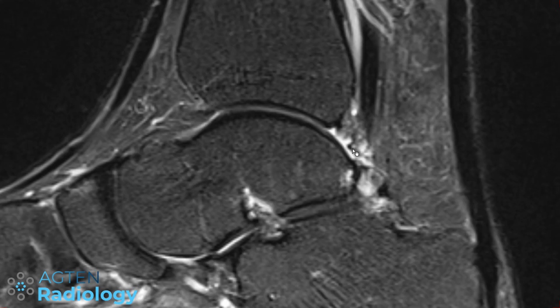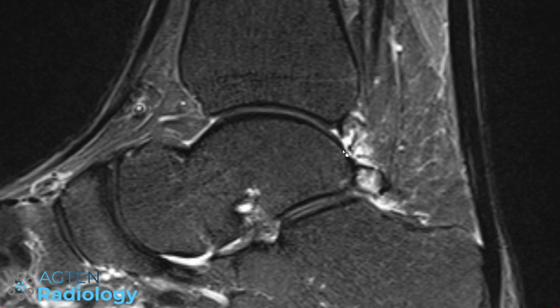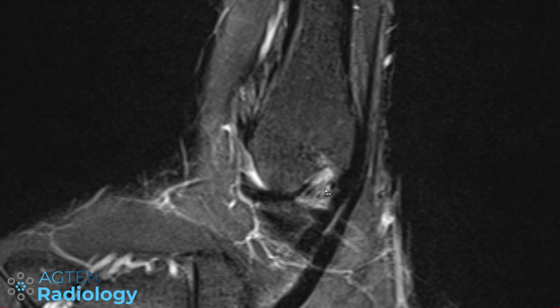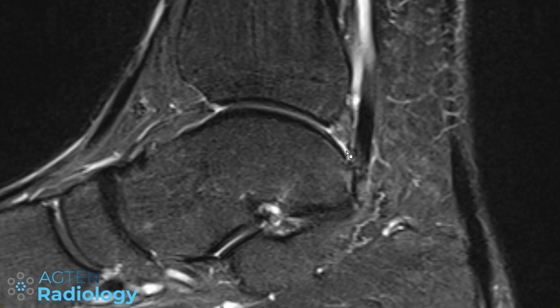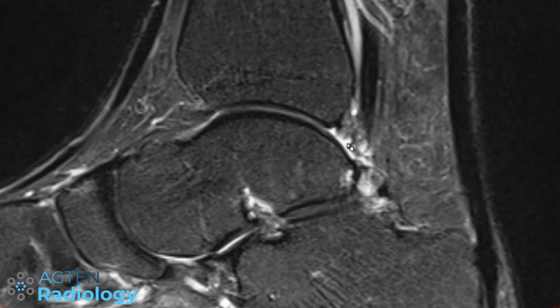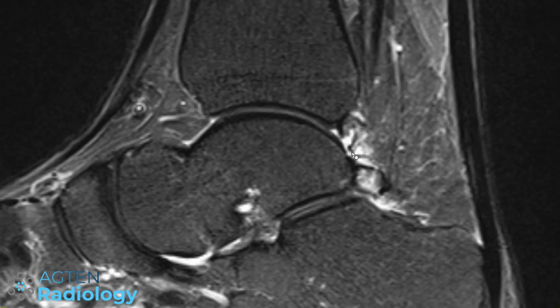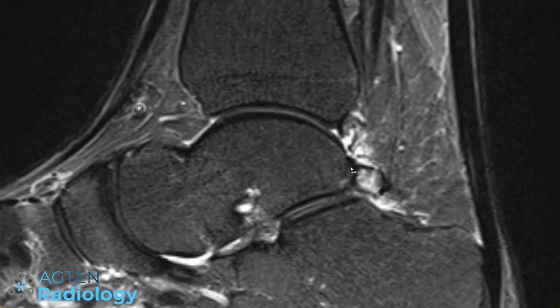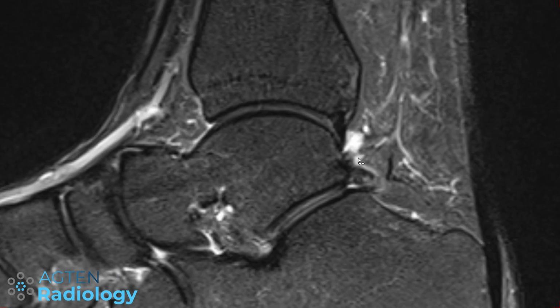And if you look closely now, you have another ligament here, which is the intermalleolar ligament. And if you scroll laterally again, you can see here the ligament. It's coming from here together with the PTFL. It's running across the joint, just where we have the joint capsule here. So this is joint capsule. And then it's blending in somewhere here with this kind of structures. Now, it can sometimes go up a little bit earlier, and the one example that I showed you there had some changes here. So in this patient, both these ligaments look absolutely normal.